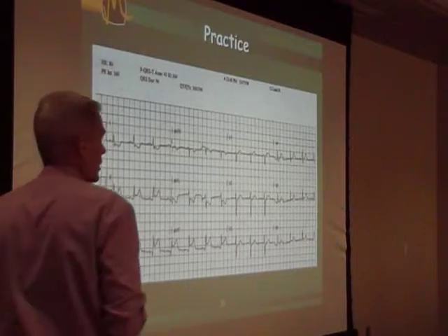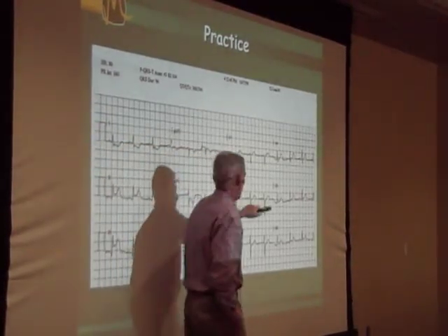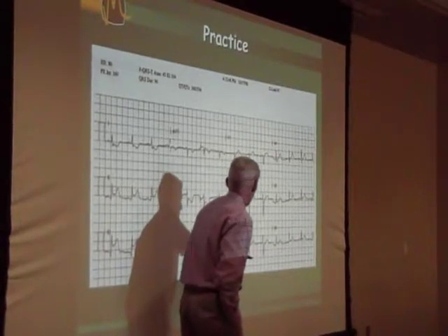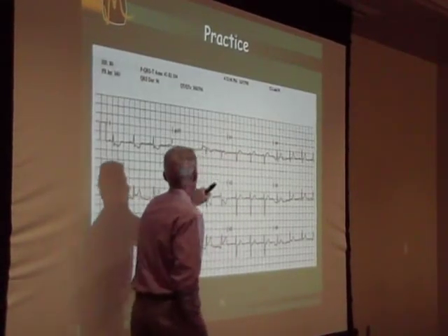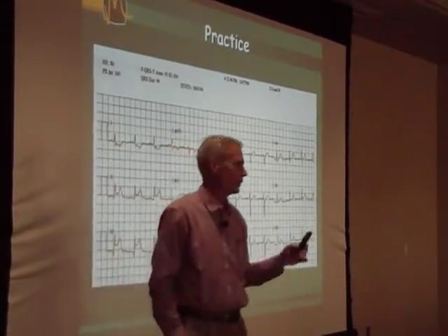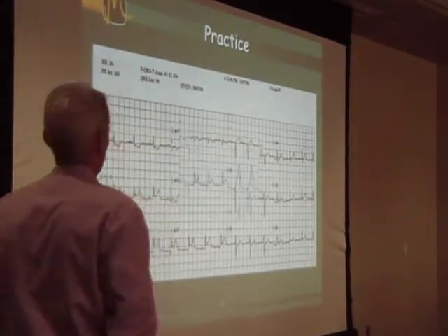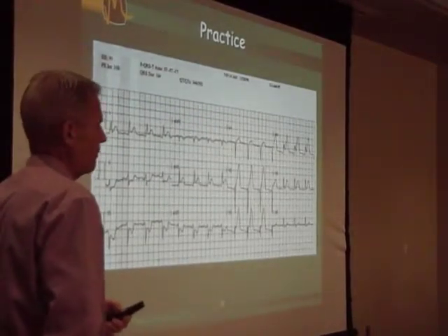Now, do we have reciprocal change in the rest of this EKG? It's real subtle, but you've got depression in V2, depression in V3, but these are significant. And that's all you need. How about the one on page 24?